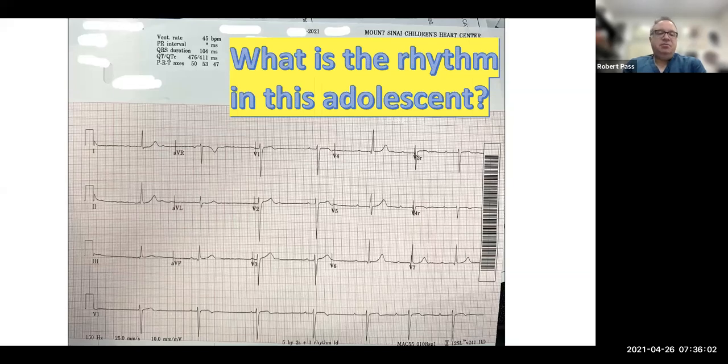I well recall I had a patient for many, many years who had a PR like this, did not have sinus node dysfunction, but had a long PR. And actually, when we did do a stress test on her, she would shorten her PR a little bit, to like 210 when she would exercise, from about 280 when she was just at rest. So I felt pretty confident that everything was okay. And then when she was about 19, she came to the emergency room following a syncopal episode, and she was in complete heart block after having been monitored by me for about 8 or 9 years in first degree block. And we put a pacemaker in her. So anyway, it's an interesting case. Thought I'd share it with you.